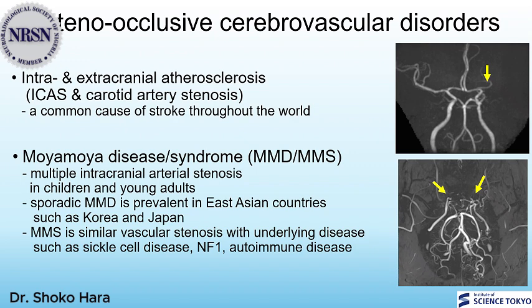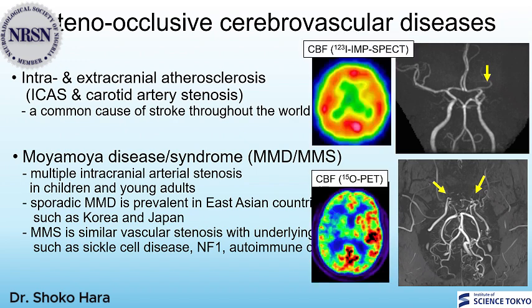So why should we also assess hemodynamic modalities in these patients? So here's why. The patient above, who has unilateral MCA stenosis, demonstrates clear asymmetry in vascular morphology but symmetric CBF.